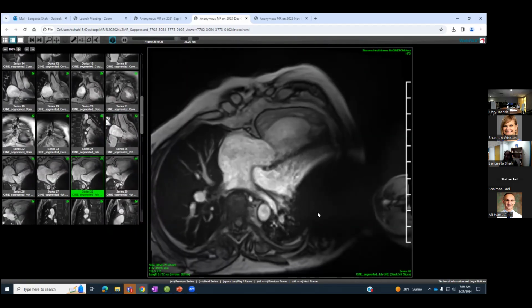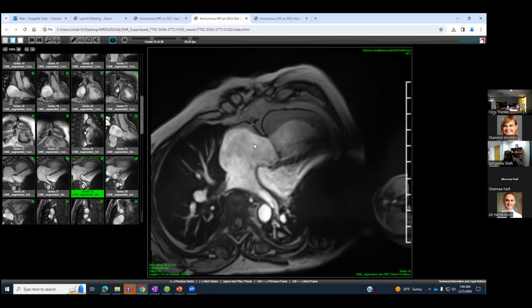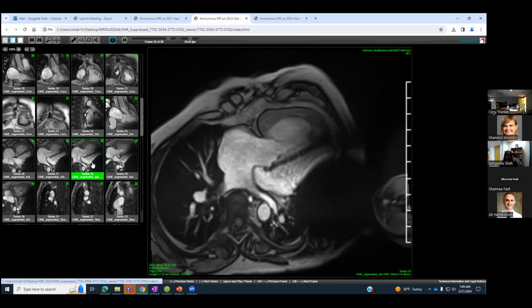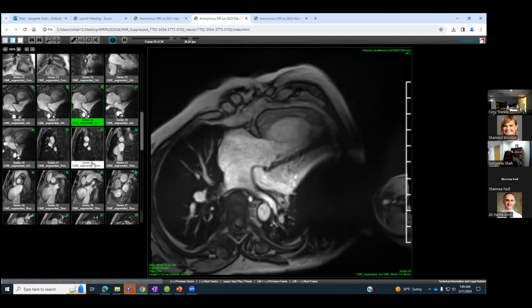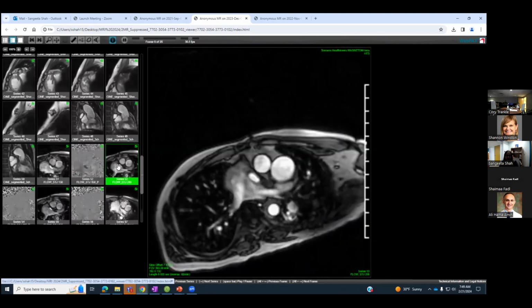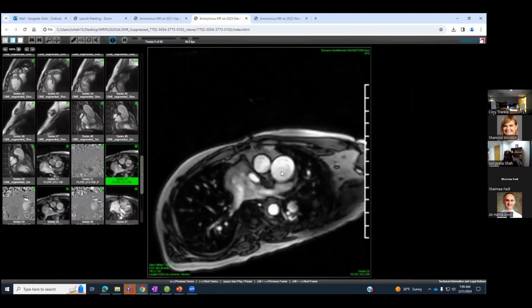28. So we have a big device artifact here on the subpulmonary LV. Here are your pulmonary venous baffles coming across to your tricuspid valve, and you can see the systemic RV is severely depressed. And then I've highlighted 53. Once again, here are your two great arteries. This is your aorta, most anterior, and this is your PA.